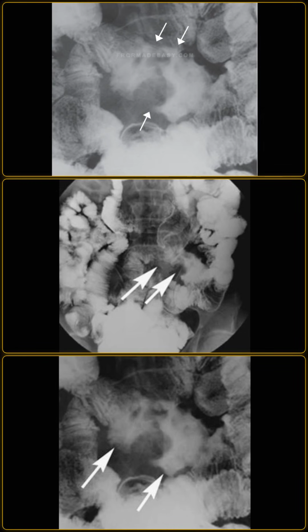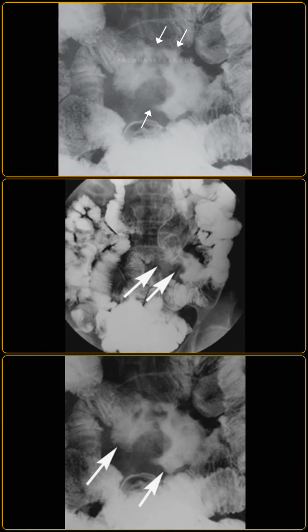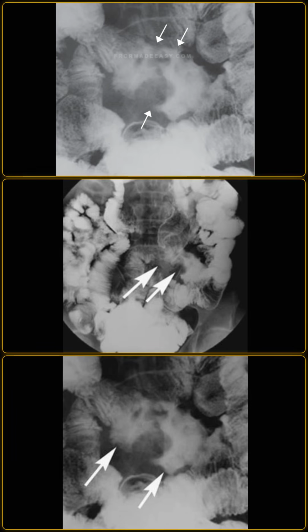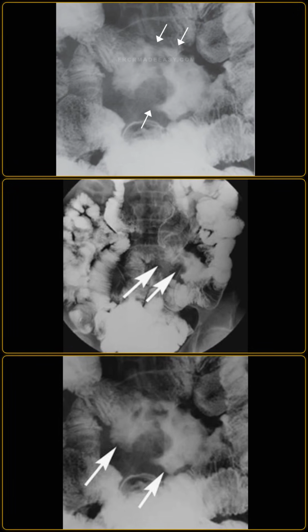There is an abnormal fold pattern characterized by an increased number of folds in the ileum, mimicking the jejunum. Additionally, there is a focal segment of marked aneurysmal dilatation in the left lower quadrant, containing numerous irregular filling defects and complete effacement of the normal mucosal pattern.